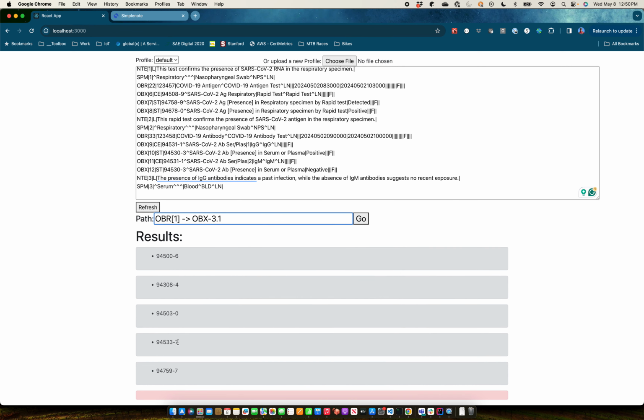So here's all the codes, and sometimes those codes are known, and I need to know the value of the response for specific codes on those observations. At least on this example here, right? We have these observations here. The third element tells me what's the test applied, and the fifth element is going to tell me what's the result, right?